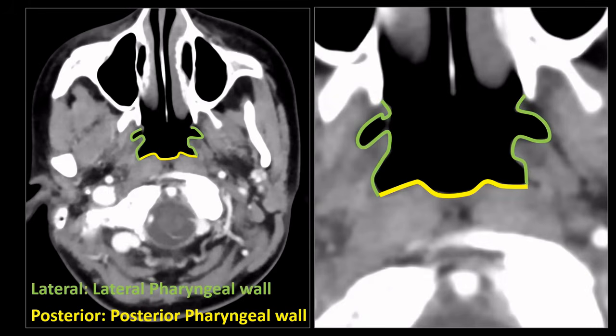And what is very conspicuous and always visible on images of the nasopharynx are these elevations or protrusions, or how would you call them? We have one of them on each side, so two in total, along the lateral nasopharyngeal walls. And these protrusions we call the Torus Tubarius, and I'm going to explain in a minute what that is exactly or what is causing it.